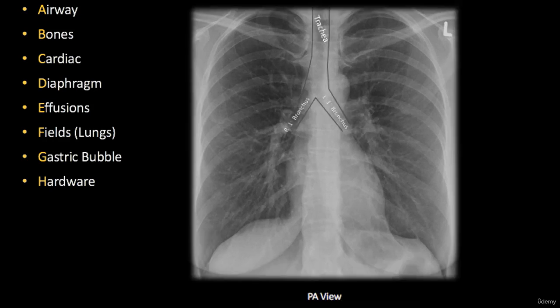The trachea is a vertical line close to the midline. It is filled with air, so it is radiolucent and appears darker on the X-rays. The carina and two main bronchi appear below the level of T4. The X-ray of the thorax is useful when you need to evaluate the placement of the tracheal tube. Is it in place or not? Or when the patient has foreign objects in the bronchi.